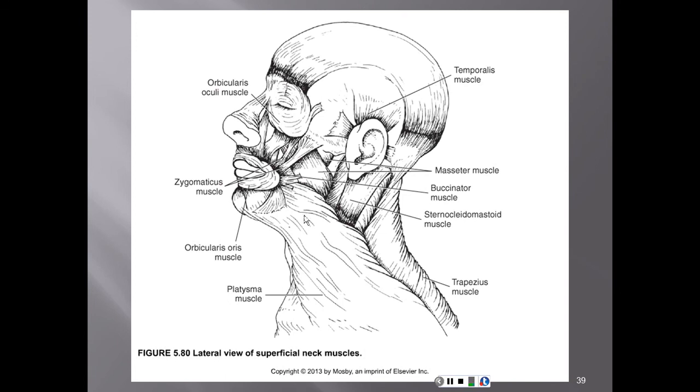And now we can identify the platysma. Now they have an illustration going all the way down. So this is your platysma muscle. All of this is illustrated going all the way down. They didn't cut it this time. So you can even try to move yours.